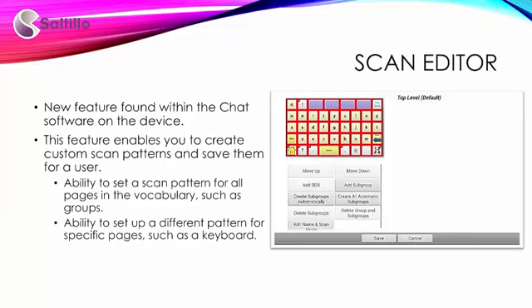There may be times when the standard scan pattern may not be the optimal set for the client. This Scan Editor feature enables you to create custom scan patterns and save them for a user. I will walk through a couple examples where custom scanning may be beneficial.